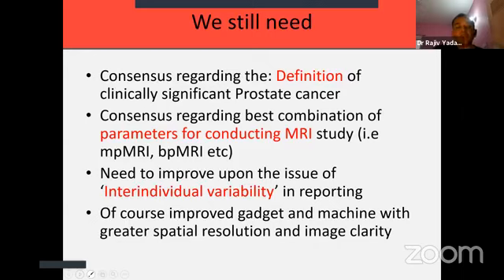So nowadays you will see that although the recommendation is multiparametric MRI, biparametric MRI, which basically means you do a T2 weighted image along with a diffusion weighted scan, both of these being non-contrast MRI, is also used. Many studies have shown, and we also feel, that biparametric MRI serves the purpose in the majority of circumstances.